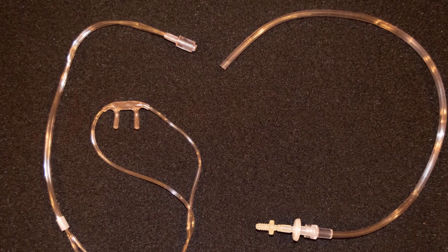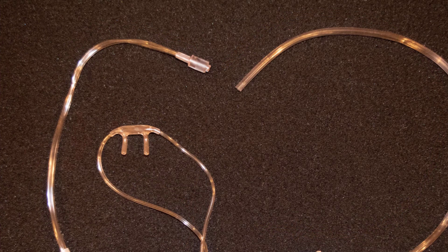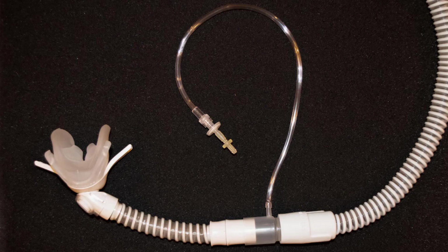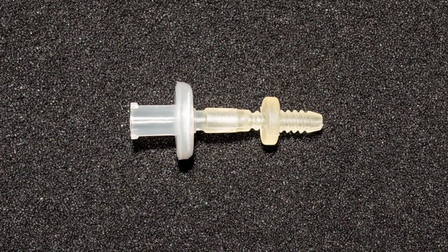Now we will need to connect this adapter physically to the Nox T3. A simple way to do this is to clip the end off of one of these standard nasal pressure cannulas. Cut the tubing at the base where it bifurcates into the two ends. Now we will simply plug one end onto the adapter and the other end into our pressure port on the Nox T3. This could also be accomplished using standard oxygen tubing, but in this case you will need to obtain the Nox filter tube connectors.